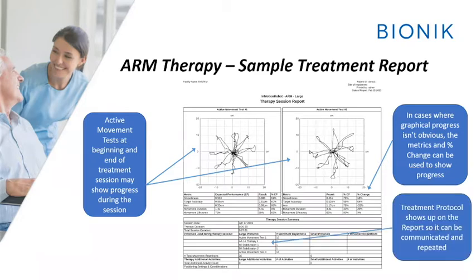The treatment protocol shows up on the report as well. This assists us with being able to communicate what we did with the patient and either have another therapist perform the same activity or repeat it ourselves so that we know exactly what we have done.